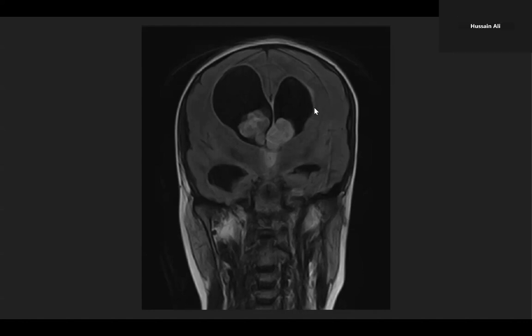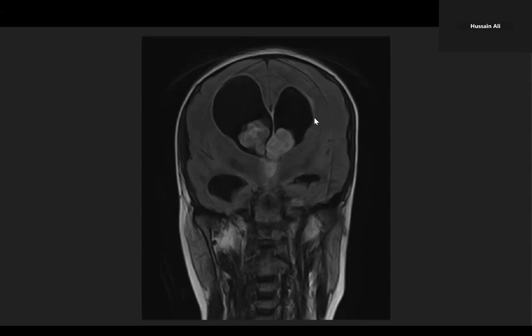Okay. This is the hyperintense intraventricular lesion extending into both lateral ventricles with hydrocephalus more prominent at the right lateral ventricle, with heterogeneous intensity. There's also hyperintensity down the lesion, I think at the level of the thalamus.